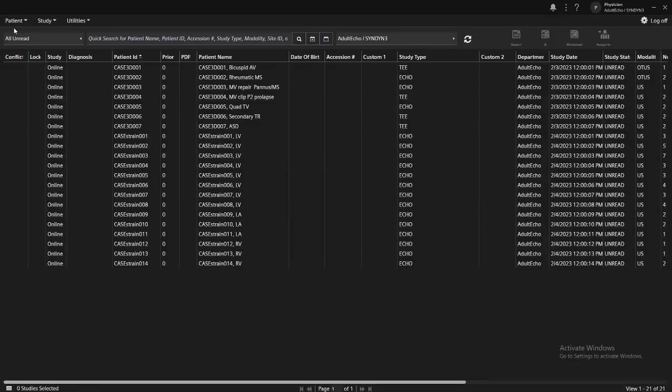So for the last case, we're going to get out of that prior case by hitting the exit button and the echo pack until you get to this spot. Is everyone at this spot? If not, raise your hand. We'll get you to this spot. Oh, we got a couple that need to get back to the patient list.